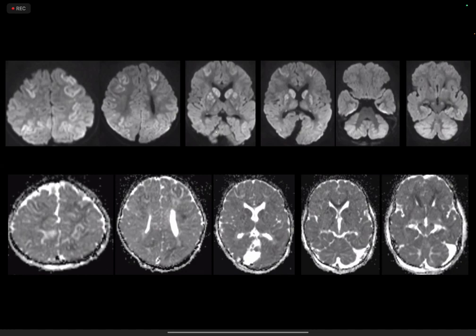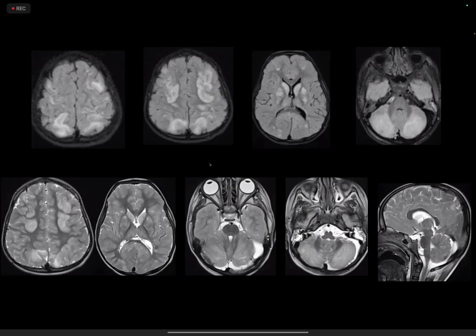Would that explain the long-term history from the neonatal presentation now? And in biotin thiamine responsive basal ganglia disease, the cerebellar white matter should be involved, like a bat-wing appearance. Here, the cerebellar cortex is involved. So yeah, that was atypical for biotin. So my strong possibility is still a POLG disorder.